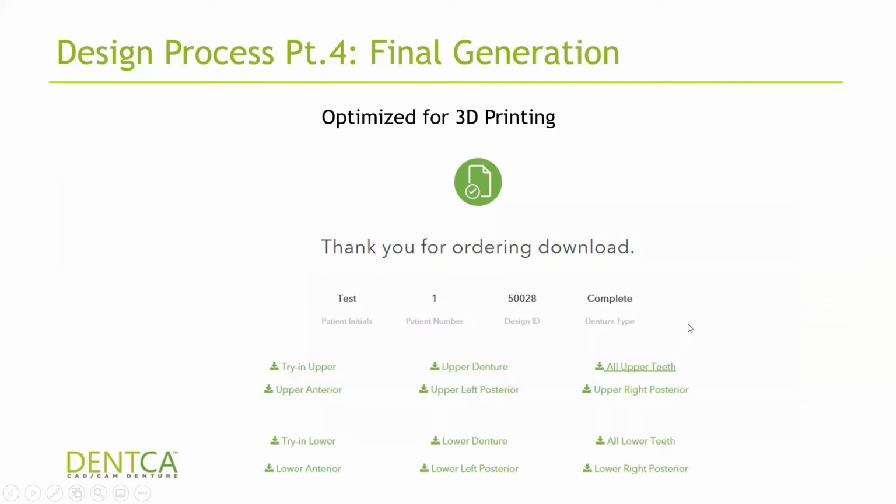And then once you download, it should look like this. It should show all the individual files as well as your initial impressions. If you don't see something like this, then let us know, but there should be at least a zip file or something that you can download. If it's completely empty, let us know.